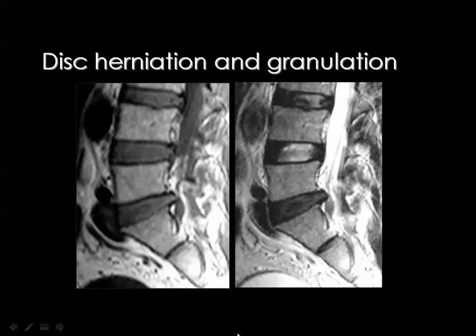Of course, this diagnosis is very important, so that you may say to the surgeon, don't operate. This is not a massive disc herniation. This is just a small disc herniation surrounded by granulation tissue, which will regress if the patient is adequately managed conservatively.